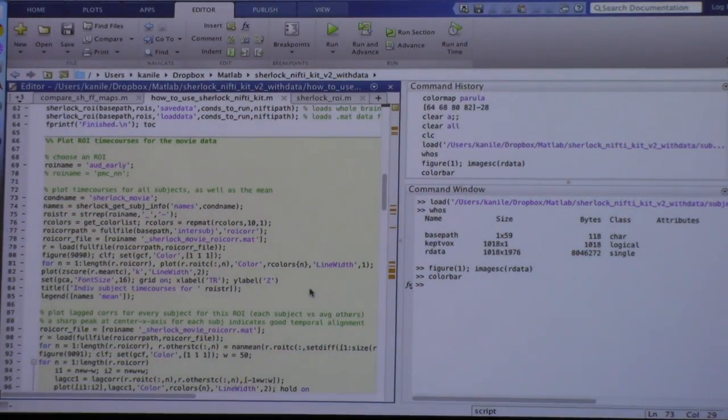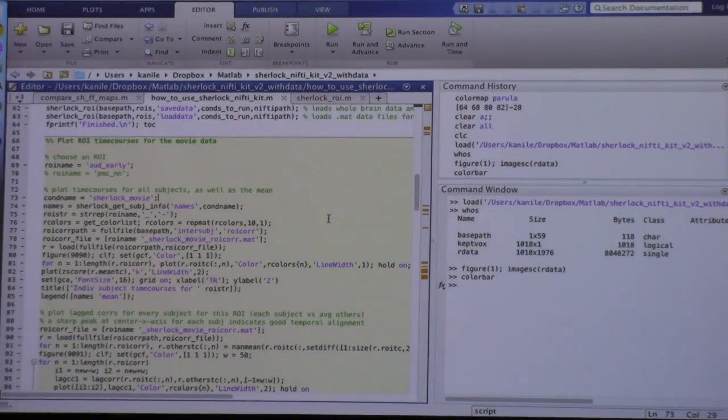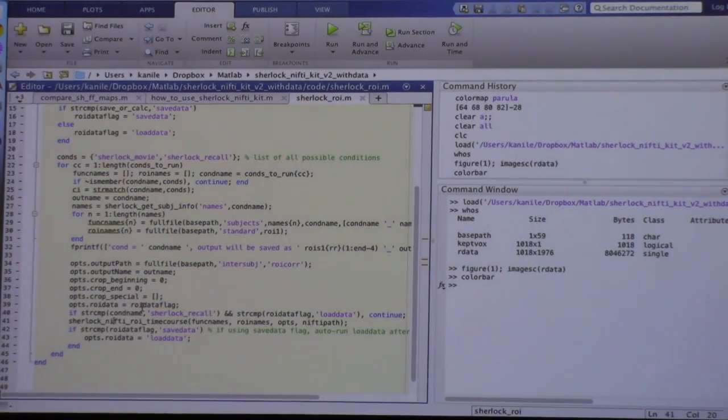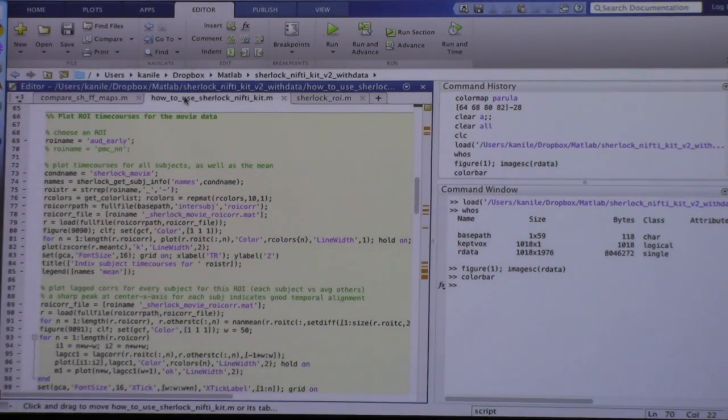So in this next cell, we can do some plotting of the time courses for this ROI. Has the data, have the ROIs been demeaned? I think in the part that was in the GitHub repo, they're already demeaned. There is a step in one of these functions that also enforces that. But I can't remember. I think that the Princeton data space NIfTI files have not been demeaned, so you could look at that distribution I was talking about.